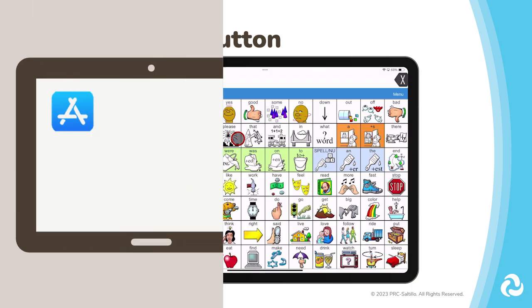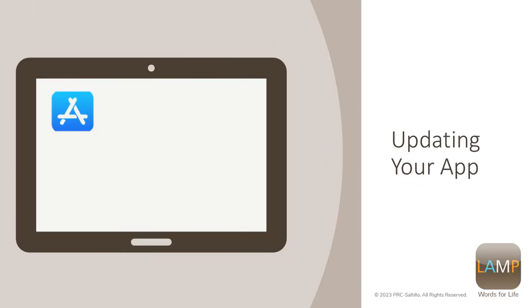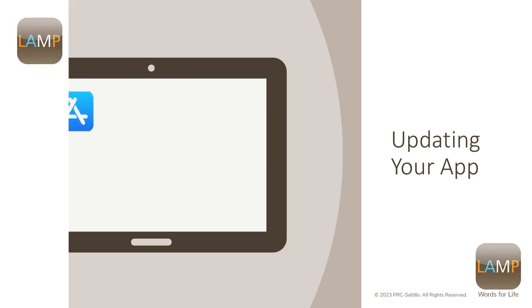My name is Joe. Keeping your LAMP Words for Life app up to date will ensure optimal performance and add new features and settings when they are released. PRC-Saltillo announces new updates on the website blog, in email newsletters, and on social media platforms.